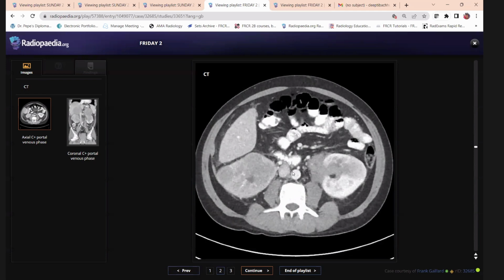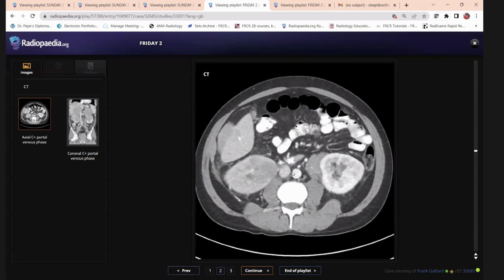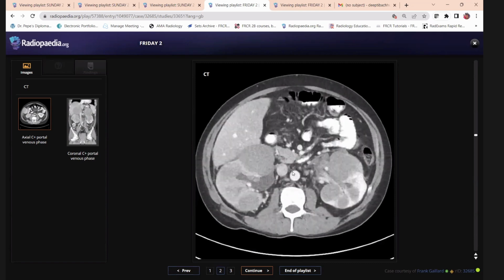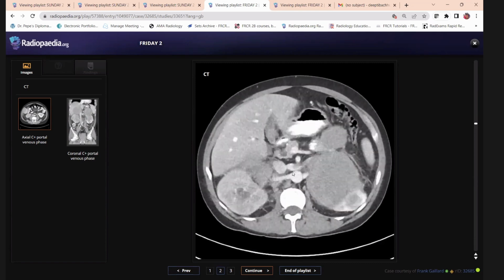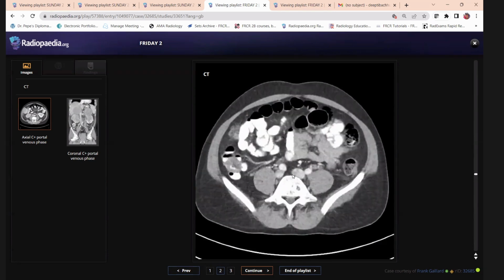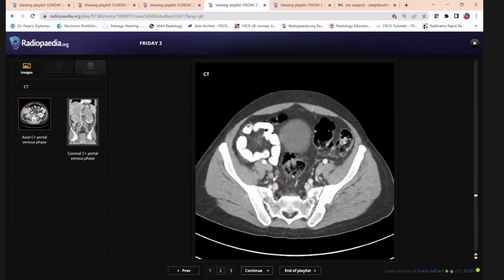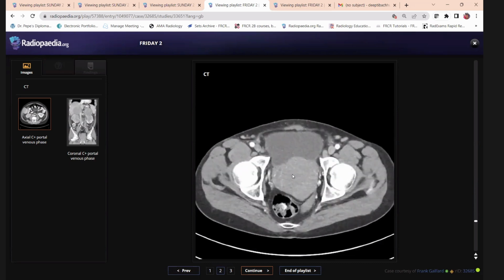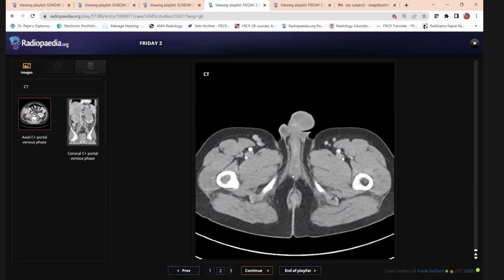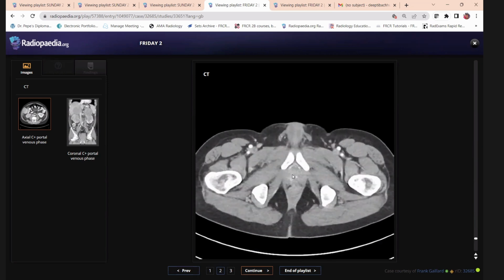Don't panic. See the case once. Completely see the case once. Don't panic. Okay. Scroll through the case completely from top to the bottom. Don't talk, see the case. Go down. Completely go down. Now again you go up and start speaking.